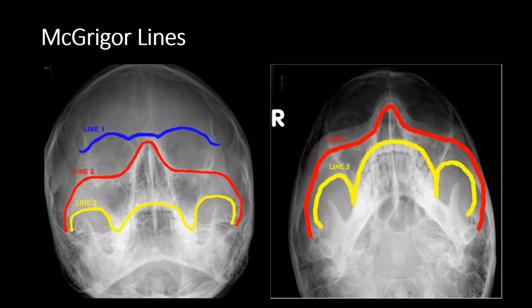So with our lower line, we go over the inferior margin of the zygomatic arch. Be careful, you can get small bumps here which are completely normal, a normal variant, and they shouldn't be mistaken for abnormality. So you pass down the lateral wall of your maxilla, assessing for fractures, over the border of the teeth and up over the opposing side, assessing for fractures to the alveolar ridge. Check for fluid levels.